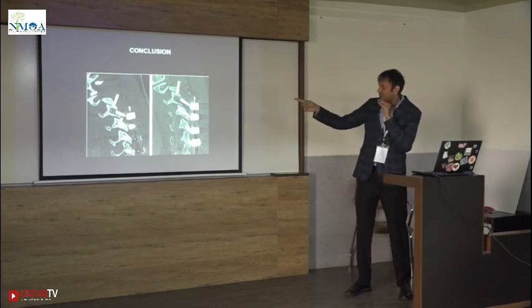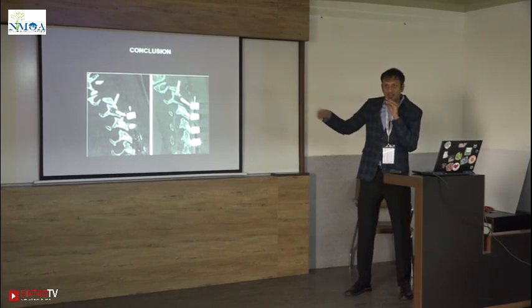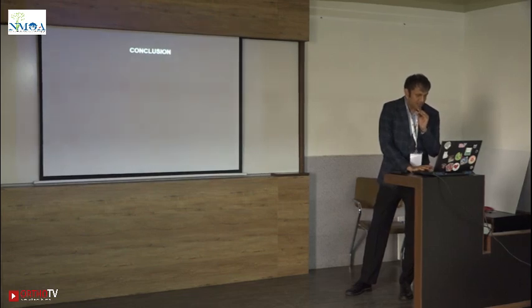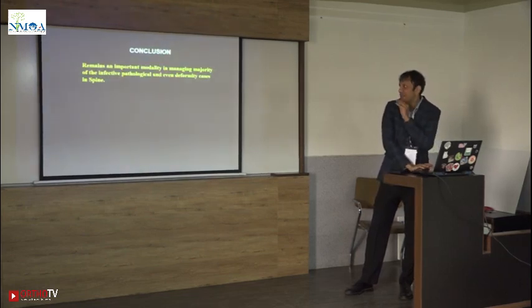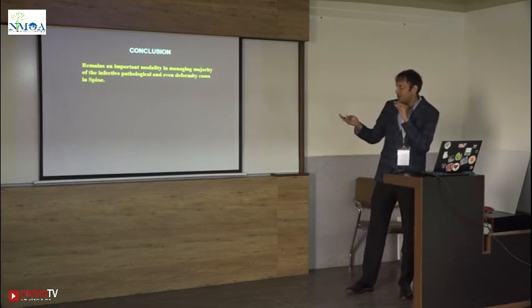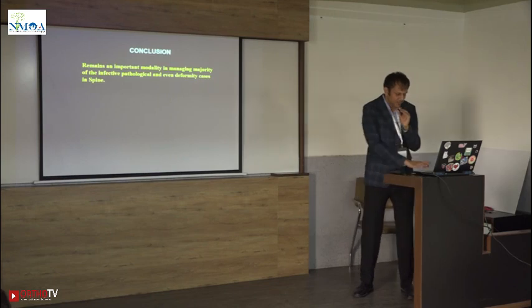Again, a screw lysis of a lateral mass where there is lysis of the entire thing and the screw is kind of backing out. So just to wrap this up, it remains an important modality in managing the majority of infective, pathological and even deformity cases in spine.